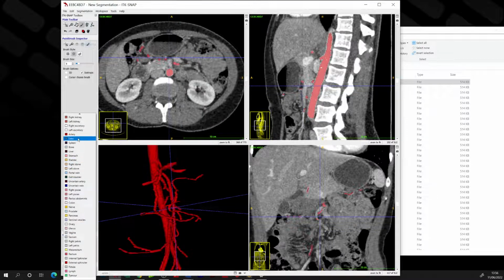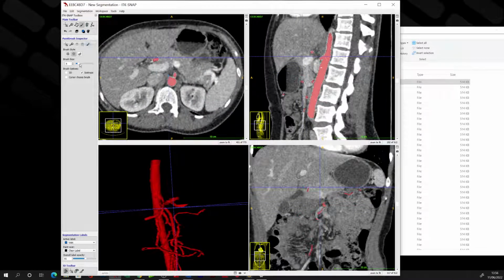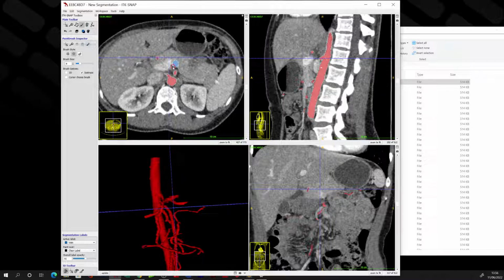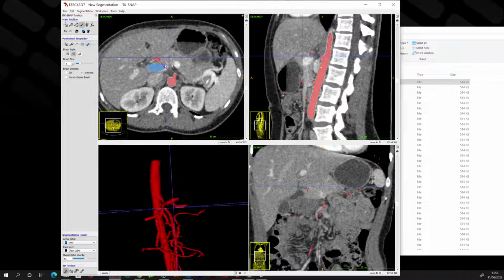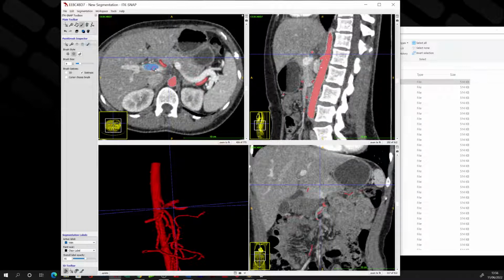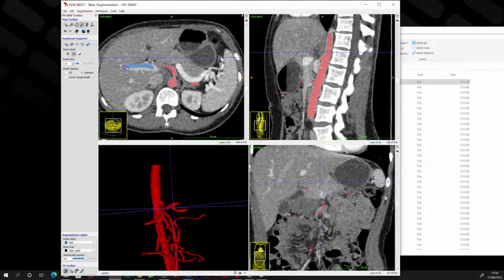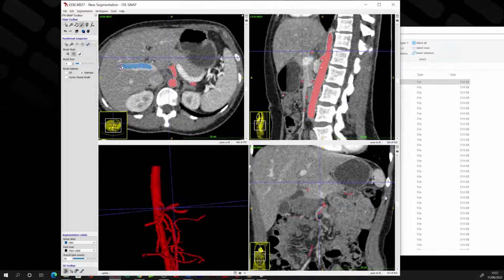Right, let's start with some of the veins. So I think in this situation, retreat back up to where it's nice and easy, and then you can get your eye in. I would say that in these sorts of cases where the veins aren't well established, there may be a degree to which you have to interpret the imaging with a degree of creativity in terms of outlining the specific borders of the SMV.